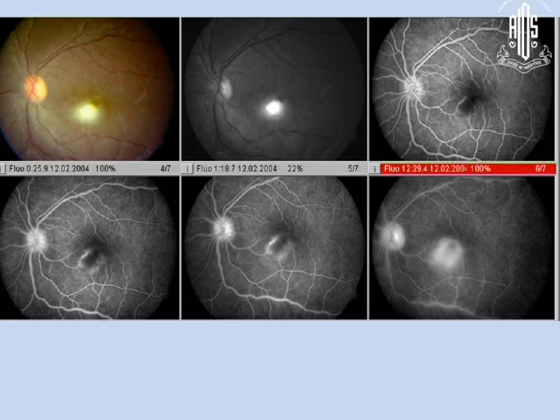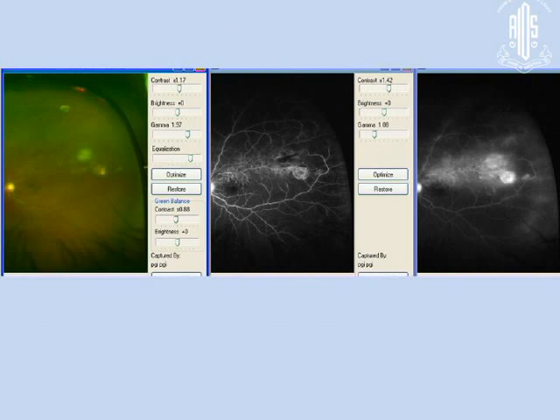It's the active lesion. Similarly, here is another retinitis lesion, and this will just tell that a hypo to hyper lesion is there. Whether the choroid is involved or not, the FFA will not be able to tell. ICG or OCT can tell this. And then again another retinitis, hypo to hyper is the main problem. Here is a healed lesion with just a pinch of hyper, a healed lesion with an active lesion.